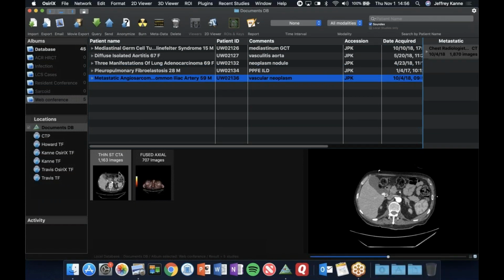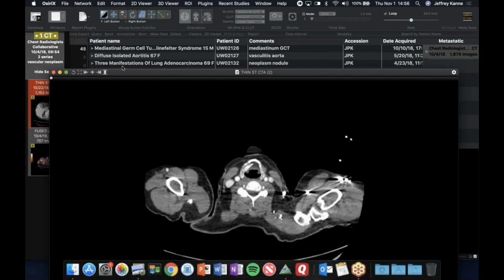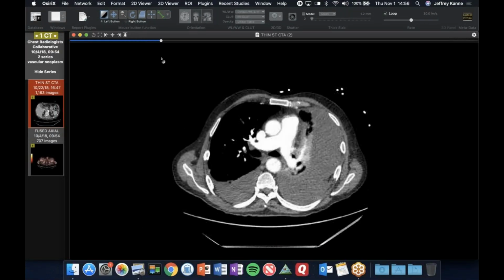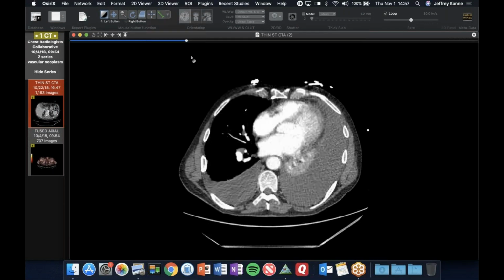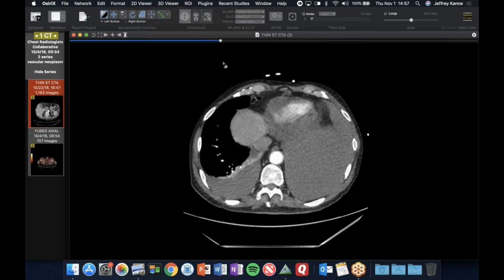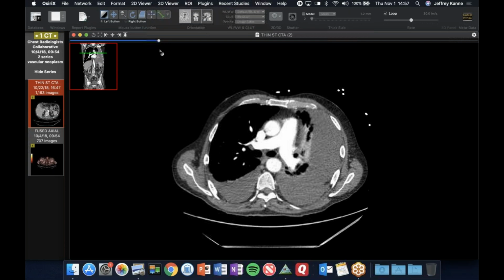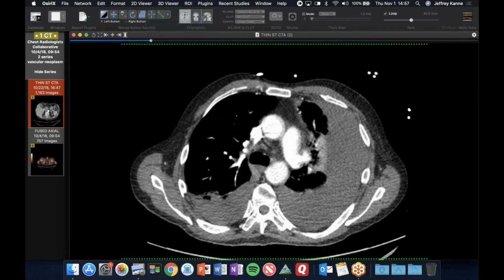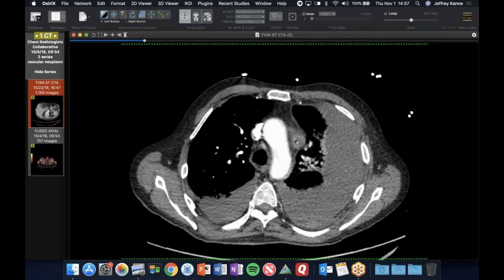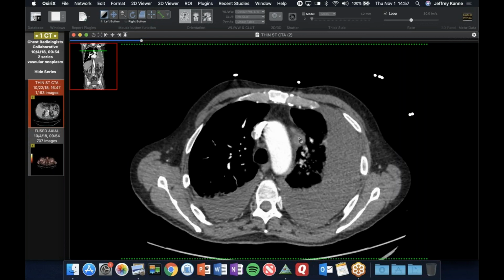Okay. Well, here's another interesting tumor case, one of these weird ones. This is a 59-year-old man who presented with pleural effusion and shortness of breath. The chest CT shows pleural effusions, and the one on the left is quite large, and the one on the right is a medium one layering, but it would make you wonder about the one on the left in particular. What I don't like about it is this mediastinal pleural stuff. It's kind of nodular, and then there's an ugly subaortic or periaortic lymph node sitting right here. So clearly this looks like a malignant effusion.